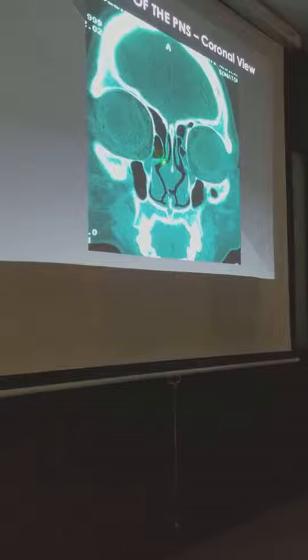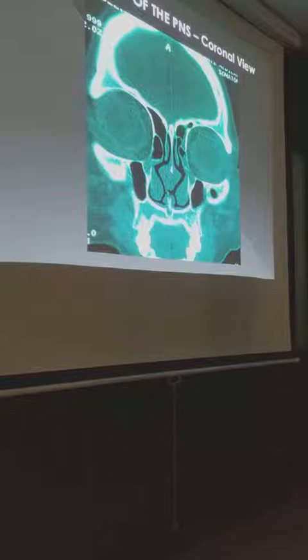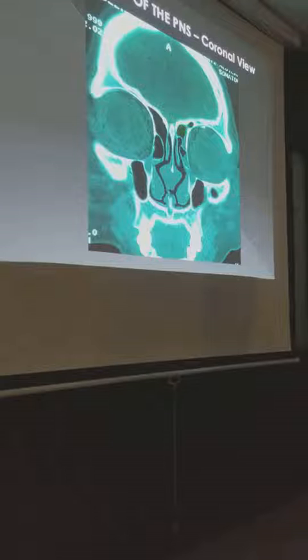Okay? So what is the airspace above it? Frontal recess. As you can see, dito sa kabila, frontal recess, and then you have the narrowing, which should correspond to the ostium, the waist. And then you have the frontal sinus after that.